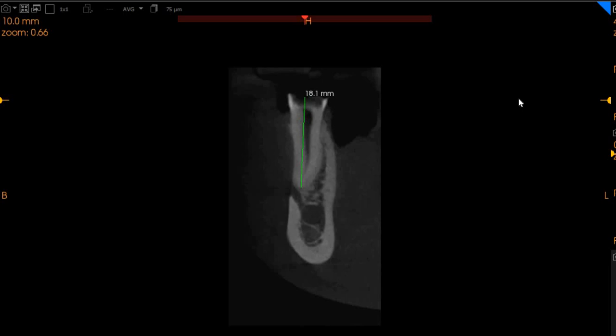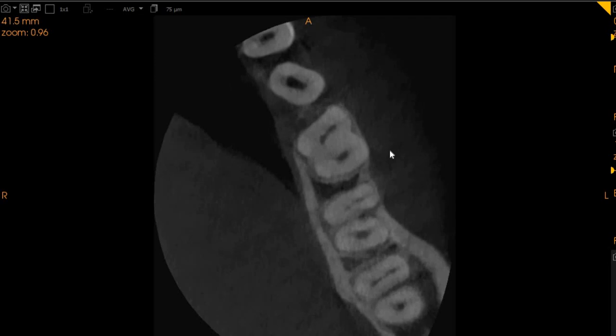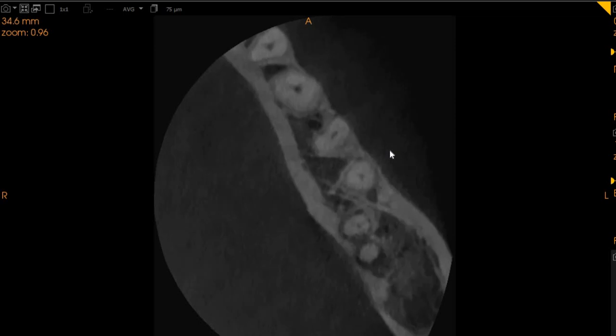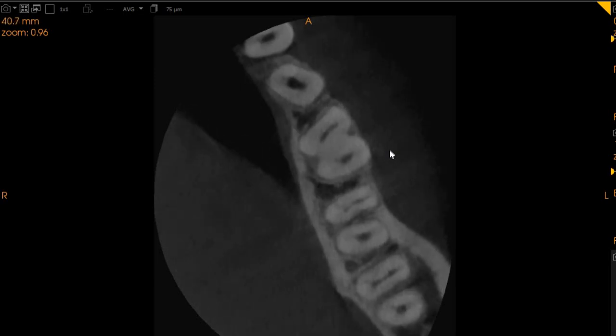Moving on, on the axial view, you can see that there's only one canal in the 5. There's one wide canal, mesiodistally. The 5 also seems to be rotated, but buccolingually, my apologies. It's only just one single canal, and no major periapical radiolucency or cracks can be observed.